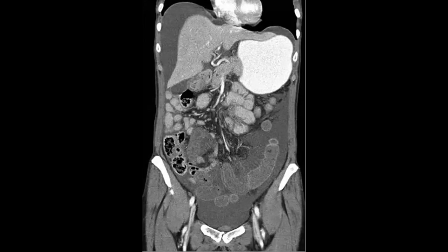So describe it. Nice, I see very nice answers. Huda, Marwa, Muayyad again, nice, perfect. So start that there is ascites and dilated small bowel loops. Surrounding the liver, the left paracolic gutter, and the bowel loops, and the right paracolic gutter. So surrounding everything.